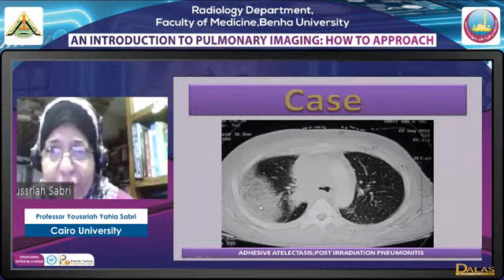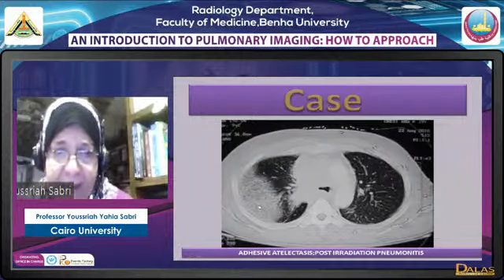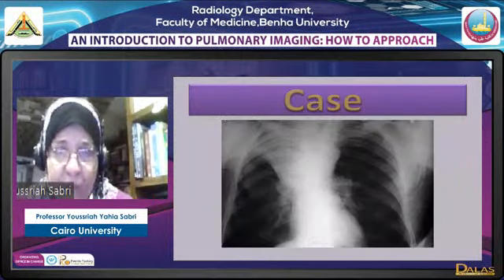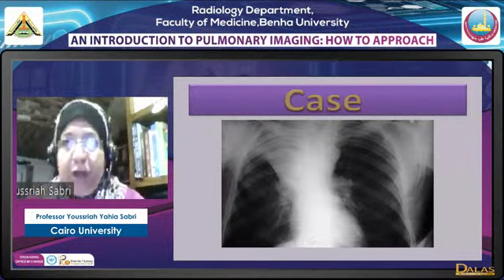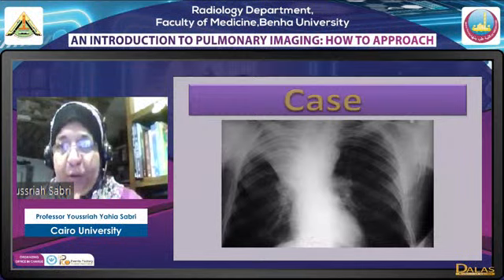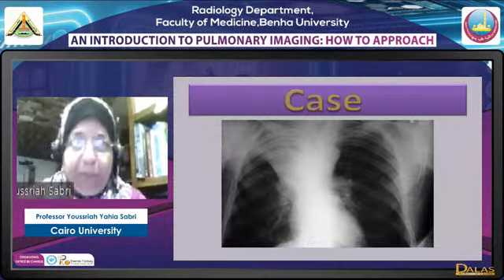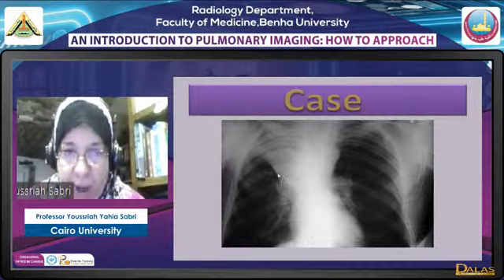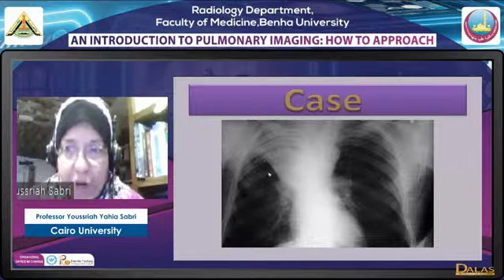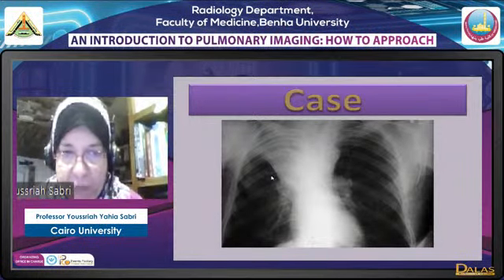There are the four types of collapse: cicatricial, resorption, relaxation, and adhesive type. Now we come to an important item: how does lobar collapse look like? This is an important item, and it's actually sort of spotting. Now, this is an opacity in the upper zone, terminated by a sharp demarcation. Sharp demarcation of an opacity is a fissure. Okay, linear sharp demarcation is a fissure.